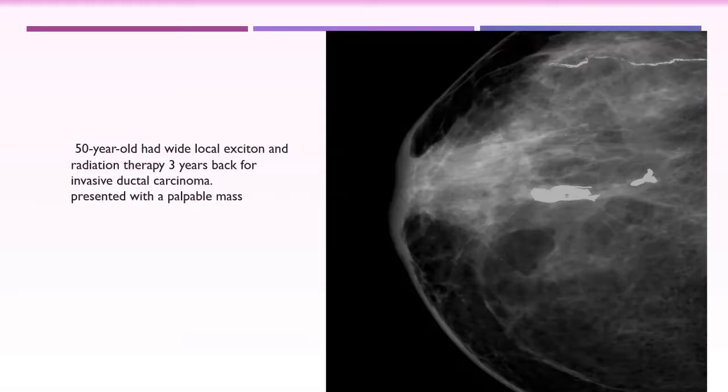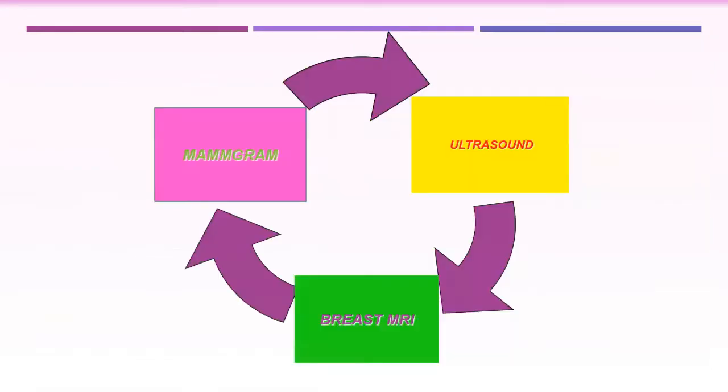What else? It will be a sign for recurrence. What else? If it displaces, that means there is a mass effect. There is something pushing this calcification from its place, indicating there is something underlying growing. Okay? These are the main features that help us in evaluation for recurrence using this type of calcification.